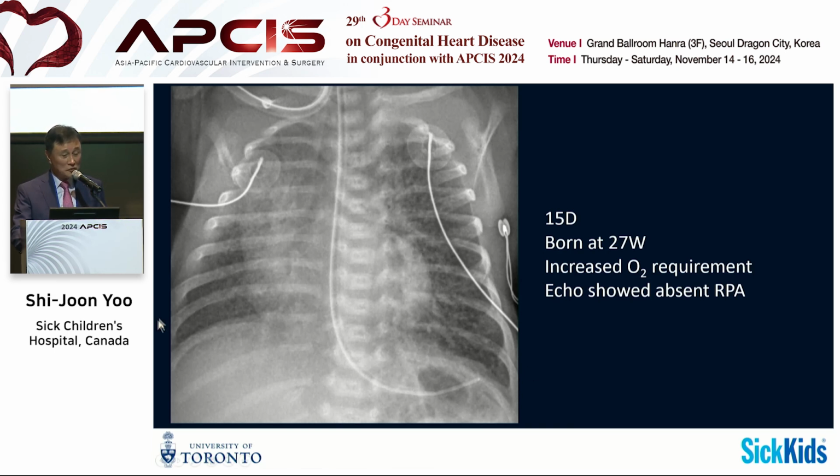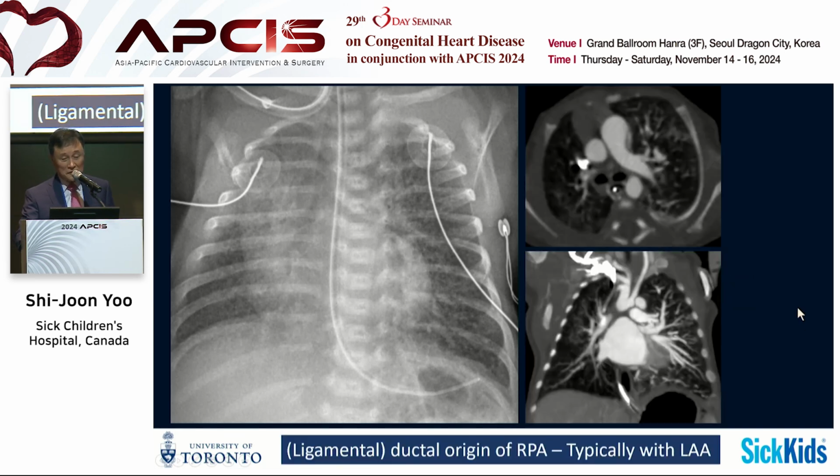Okay. So this is another one, 15 days old, born at 27 weeks, increased oxygen requirement, echo showed absent right pulmonary artery. So this is actually the typical finding of another ligamental ductal origin, of the right pulmonary artery, in which the right lung is severely hypoplastic and the trachea is displaced toward that. The heart is also following the displacement. Okay, so this is the CT scan. You can see absence of the mediastinal segment of the right pulmonary artery. The small right pulmonary artery is here. And then you can see from the left aortic arch, this is the right brachiocephalic artery. There is the small duct coming down.